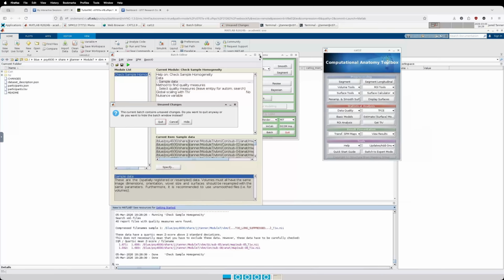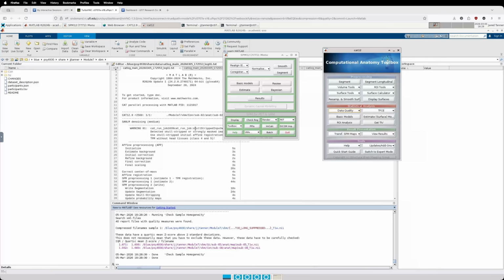That's a quality step that you would go through. But now we're almost ready to run the VBM analysis. Not quite there yet. But one of the things we would want to do is we need to smooth the data. So I've said in class and other settings that all the brains have been registered together. They've been all aligned, but that alignment isn't perfect. So we want to do a little bit of blurring. And so we want to smooth the data. So this is going to be on the SPM12 side. And then we'll just come here and click on smooth.